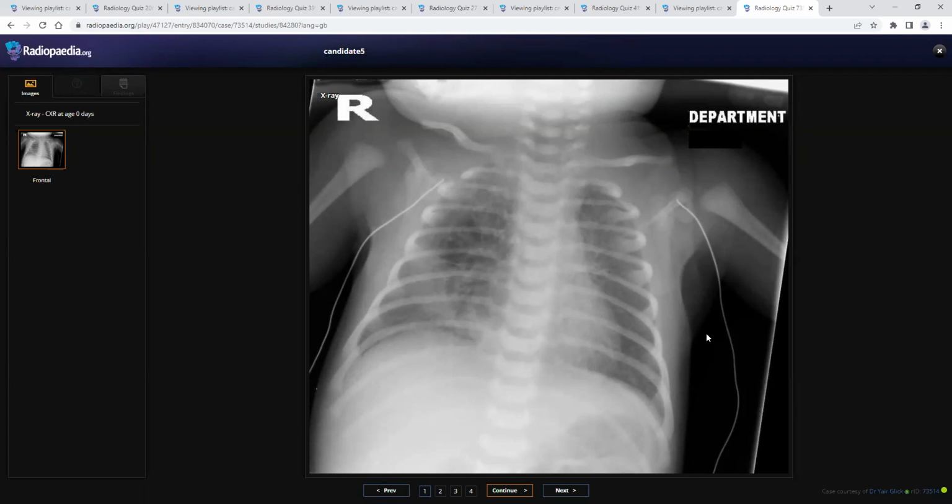CPAM, although I can see lung between the right hemidiaphragm and the lesion. So my second differential would be hernia, but that is not the usual side in children. It's mostly on the left side.